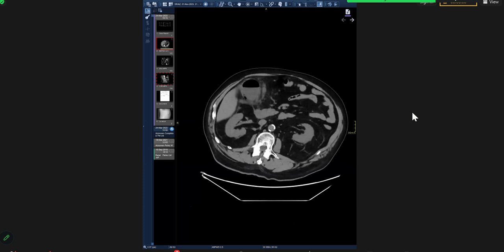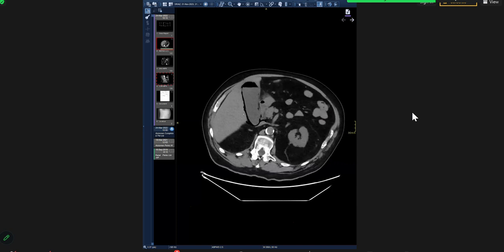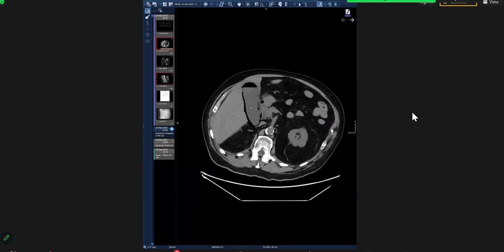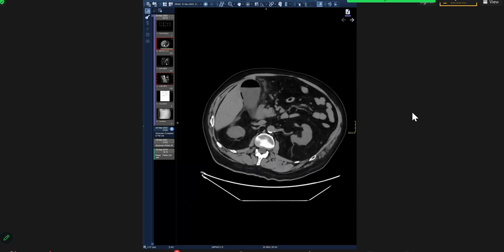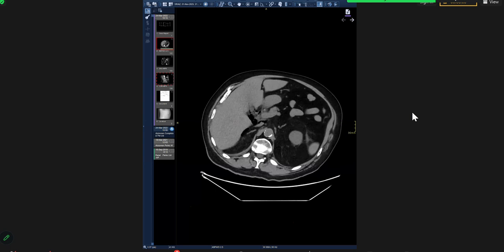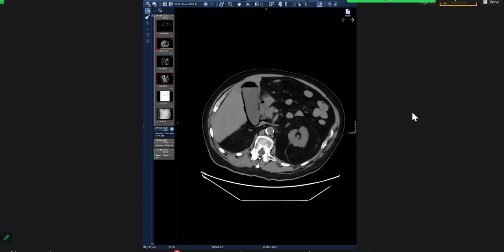So this is an emphysematous cholecystitis with perforation. See that? And it is basically an infective process. There are no stones in this one, but diabetic patients, for some reason or the other, are prone to these things. Another thing is sometimes they have gallbladder stasis. Like they don't eat, they are sick, and when the gallbladder keeps distending, it becomes inflamed. Okay, so this is it.